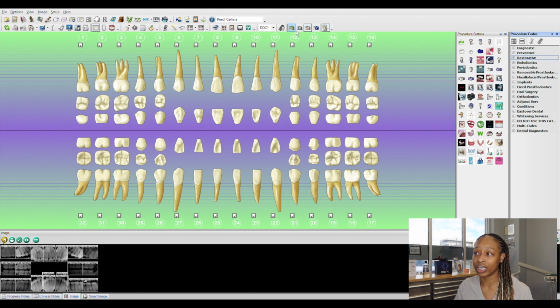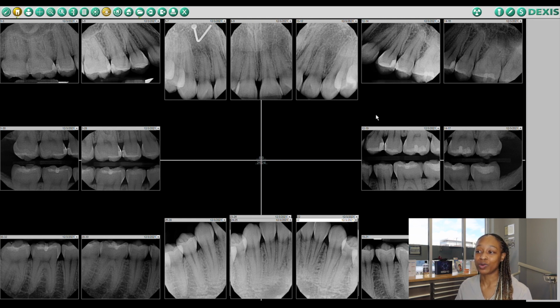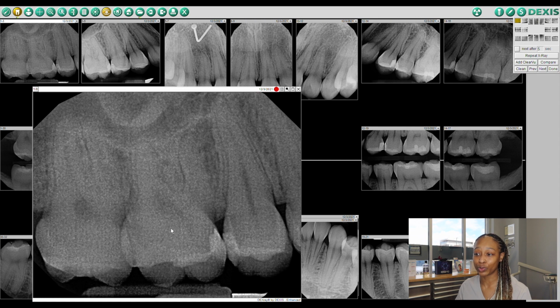And also when you're charting, you need to look up here at these where it has existing, other, treatment plan, and what's completed. So we're gonna be charting things that are existing. So I'm gonna hit that EX because treatment plan would be saying she needs these things done. But right now, all we're doing is reading X-rays and charting them. So that's how the chart looks, but let's just go back to the X-rays, go through those and write down each surface.